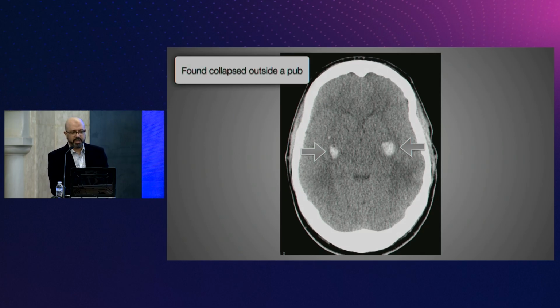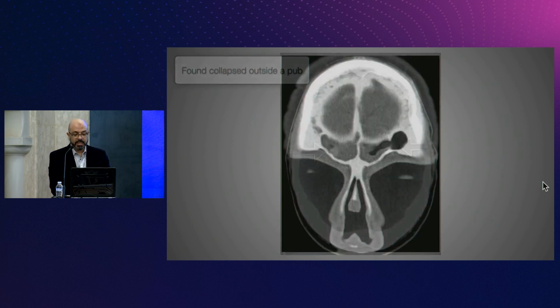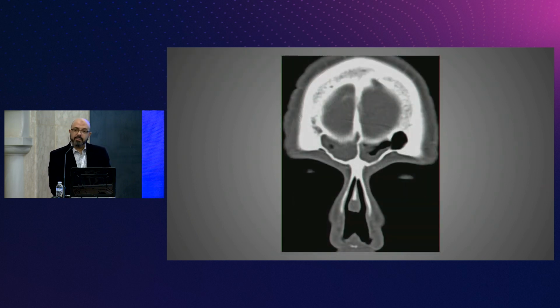Hypertension, right? Yes. So we need to find out why this young patient all of a sudden had his blood pressure just shoot up. And the clue was on the scan itself. What's wrong? Nasal septum, where is it?